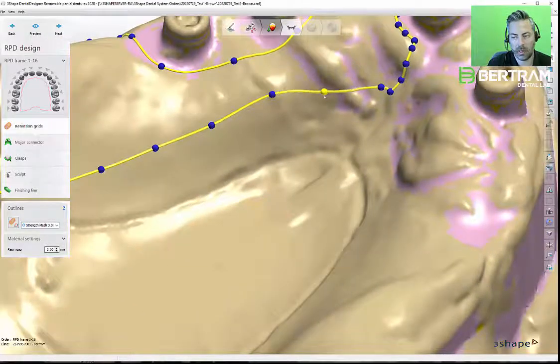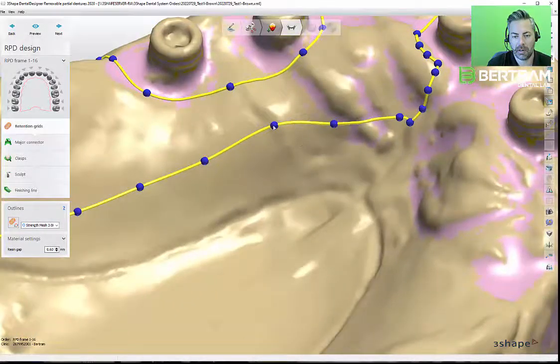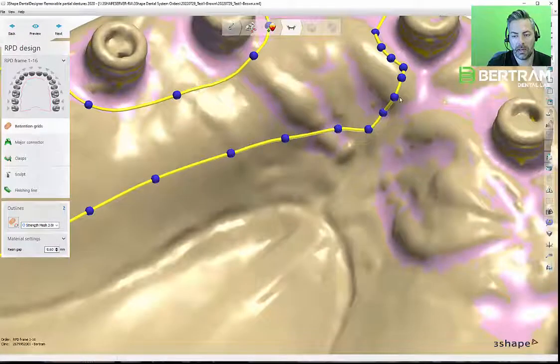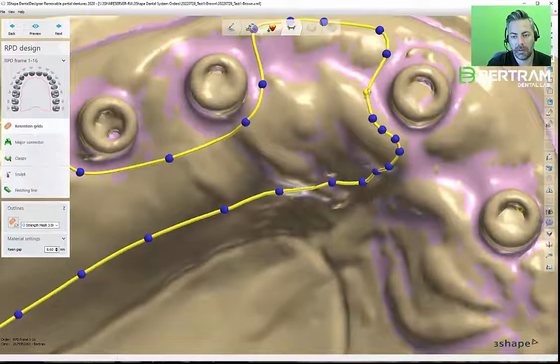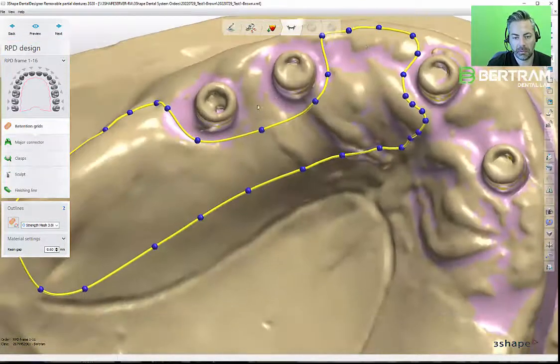It is much easier with the drawing on here. I don't think this one has a texture scan with a drawing. But I do suggest, if you have a physical model, to put a drawing on it ahead of time. Even if it's just a quick outline, it will save you time. When you have a quick reference, you're not trying to rework your splines.